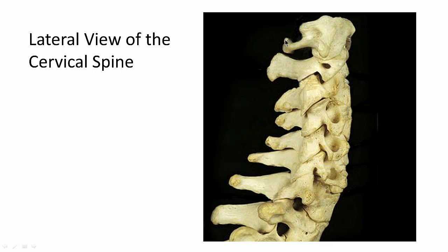This is actually not the spinous process. This is the posterior tubercle of atlas, right? Posterior tubercle of atlas. Anterior arch and tubercle kind of combined. You can't really tell. You can't really see the lateral masses from this view well.